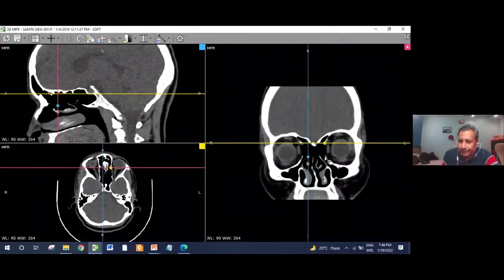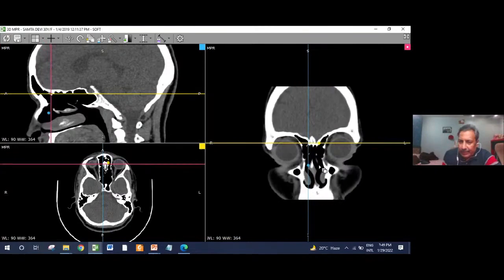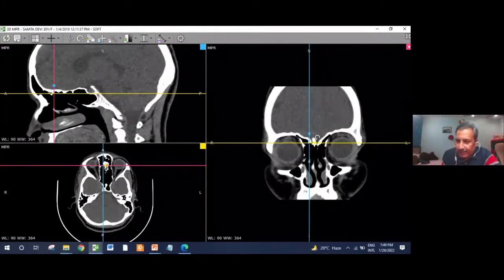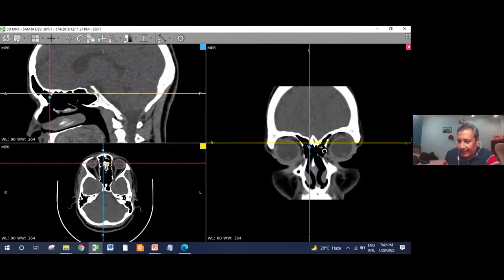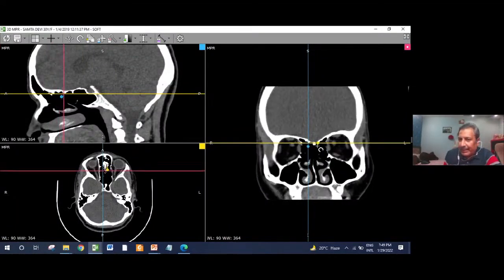Now see, I am coming far anteriorly, here, going behind. See, this is the cribriform plate. Now, the cribriform plate is forming the roof of the anterior ethmoid here. Along the roof of the anterior ethmoid, this is the cribriform plate, the crista galli. As you go behind, the cribriform plate is disappearing. The anterior ethmoidal roof is going back.